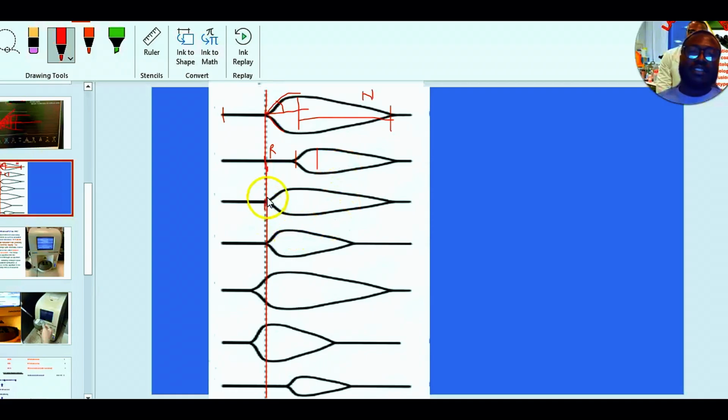Here, the R time is normal compared to the normal graph. You can see here, the R time is okay. We love that. Then what about the height? Let's compare this height to that height. You see, this is wider, so the maximum amplitude was so much wider compared to here, which is really short. So there is platelet deficiency here. There's thrombocytopenia present here. However, the lysis time was okay compared to the normal one. So there wasn't any problem with the lysis here.